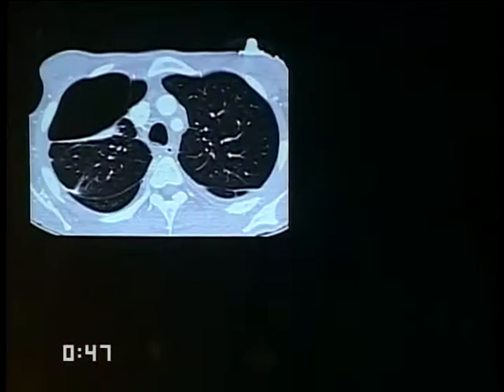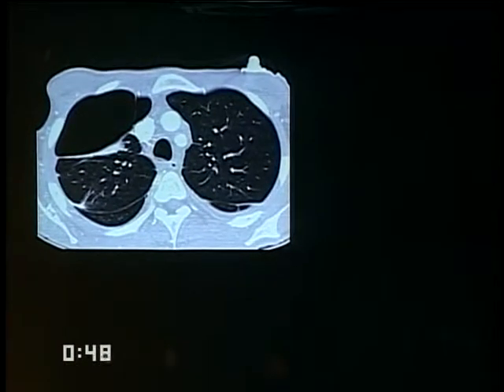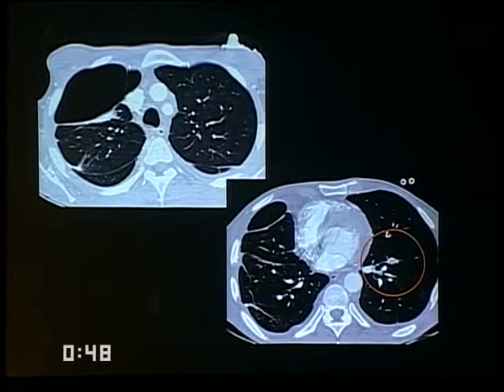I talked about the benefit of alternative diagnosis. Here's an example. This was not suspected on the chest X-ray. We have a large loculated anterior pneumothorax in this patient that was being ruled out for PE. Interestingly enough, he did also have pulmonary embolism. And this is a different kind of problem, in that pulmonary embolism, we're realizing, is a very prevalent disease, especially in patients with underlying malignancy. So knowing what the significance of a small embolus is sometimes difficult.